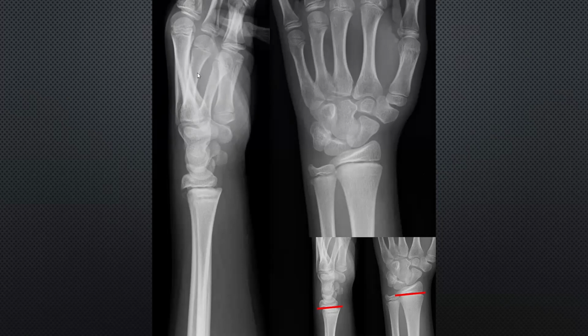So you can see the four borders. What is above the wrist? Digits. What is below the wrist? The radius and ulna. So you can see up and you can see down, and you can see the soft tissues. So it's an adequate X-ray, right? Is this one accurate or not accurate? Not accurate, because the patient's name, date, and information letters are not there.